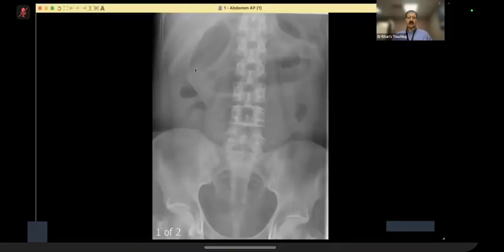Now, candidate one, a bit of feedback for you. Please remember, when we do a plain acute abdomen series, we do a supine X-ray of the abdomen and a chest X-ray. The pneumoperitoneum is seen on a chest X-ray. On a supine film, of course, there can be signs of free air, which this case was about, but you were referring to gas under the diaphragm.